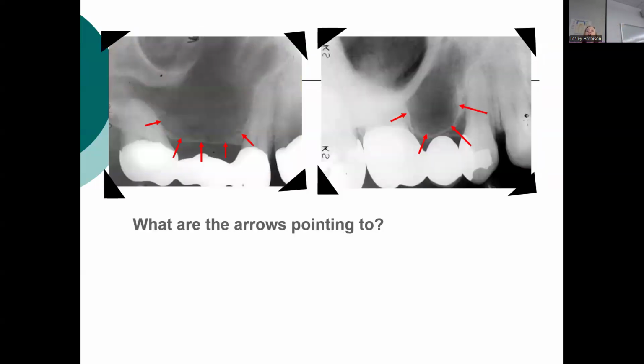Here it is again. A lot of weird sinuses. Sinuses can be really low. The roots can be up in the sinus. That's why some people have a procedure called a sinus lift, or that's why their teeth hurt when they have sinus infections, because the roots of your teeth can be very close to the sinus. So it looks like the sinus just fell right down in. They've had bone resorption and remodeling because they lost those teeth.